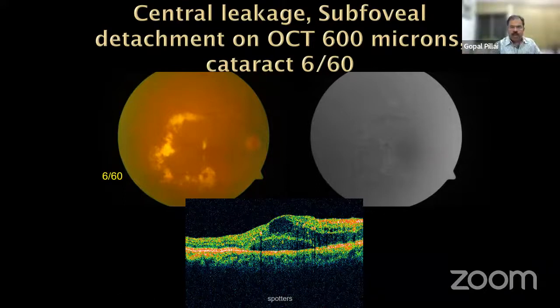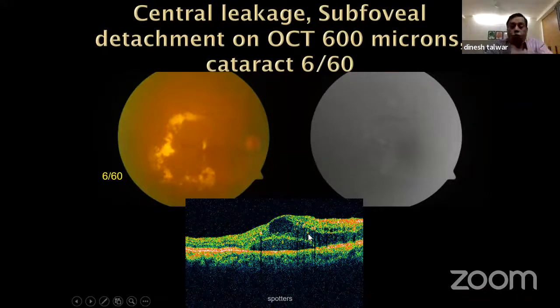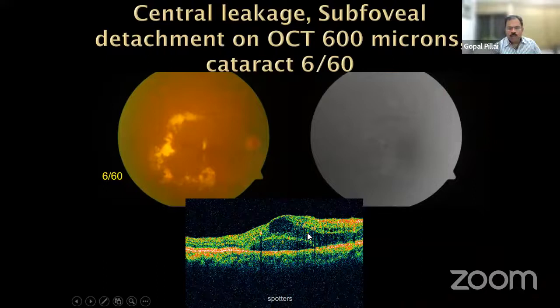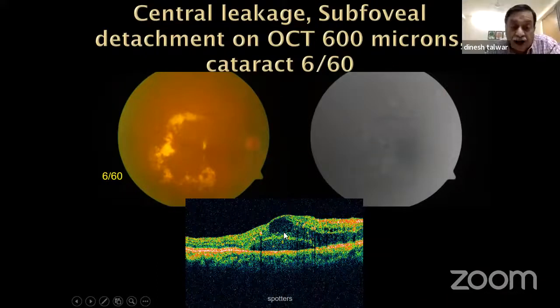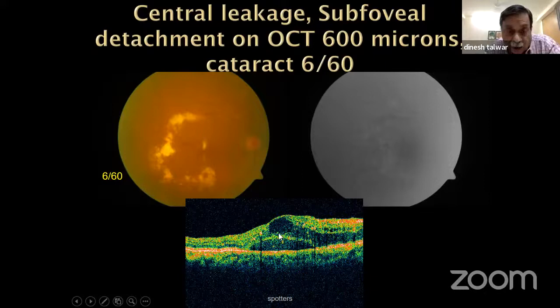Is there a difference in shadowing, size? You look at the picture. Gopal, can you show them? There's one yellowish thing here on one side of the cyst, and you can see that one, sir. This one going all the way down. This one on the other side, and there's one here also. There's one there also. Yeah, you were right. There, here, and on the other side also. There are two here. You can see.